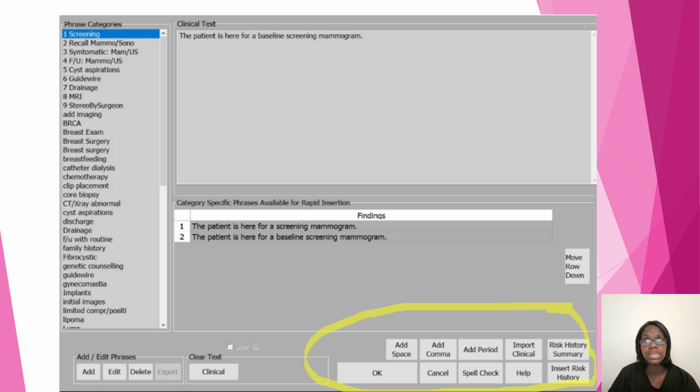They like to see that the pushbacks were performed. So you have to put information in like that, the displacement views. Sometimes I see displacement views were performed, sometimes I do not see that. So going to import clinical should be the first thing you do.